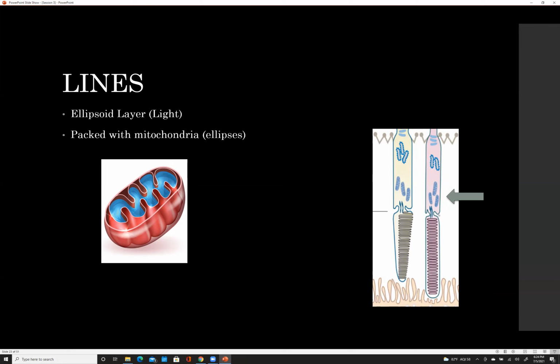Does this make sense? Yeah, and this is when you're talking about the inner segment. When we talk about the inner segment, outer segment of photoreceptors, you're saying all three of these make up what's known as the inner segment? Well, you can argue that the external limiting membrane is sort of a dividing line, like is it in or out? It's kind of like the ELM is where we start, and then that's where the inner segments begin. And then the inner segment is actually comprised of, OCT-wise, the myoid and the ellipsoid. Perfect. Okay.